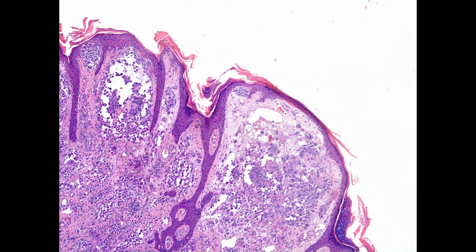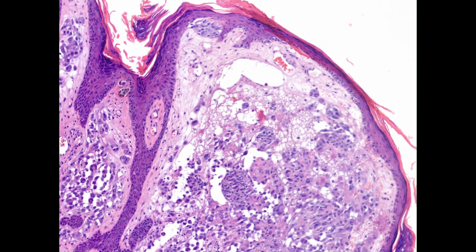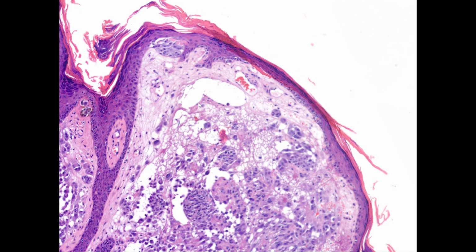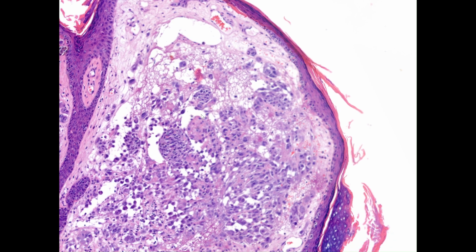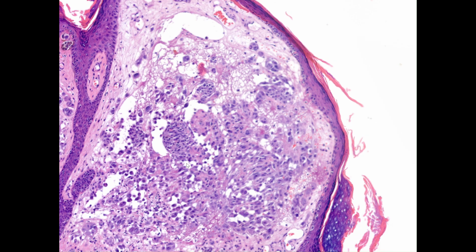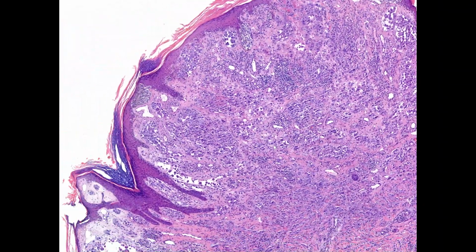What we're seeing here that's different and tells us that we shouldn't be thinking about a mainstream Spitz nevus is this kind of change. We'll look at a couple of different areas where we see it as well. What we have here is loosening of the tissue and pallor. I call it edema, although I don't really know that it is. It certainly has the look of edema. And then you can see there's some fibrin deposition as well. And then concurrently, there's this crumbling configuration in nests.